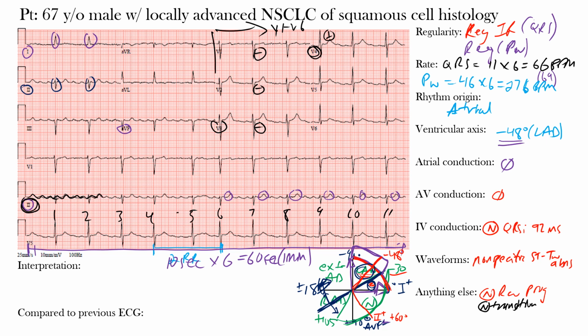You just have these P waves that are going up and down throughout, even occurring within our QRS complex. So if you were to draw this out, you'd see a P wave that's actually coming through our QRS complex. This is the main thing I wanted to point out, that there is no isoelectric baseline. That's an important point for this underlying rhythm that you're probably starting to figure out. So, no isoelectric baseline.